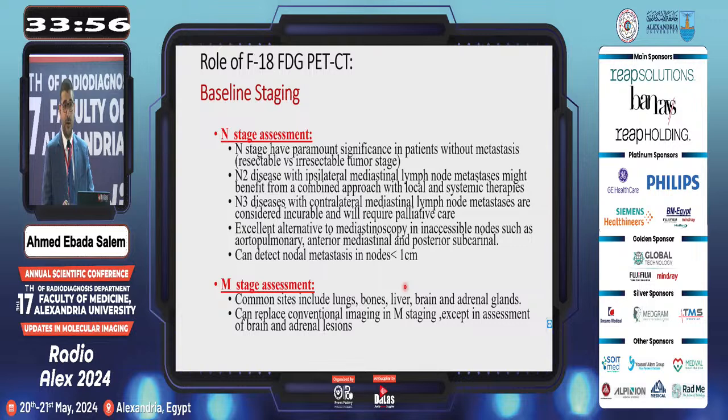So if it's a new adrenal nodule that developed during the course of treatment, we can suggest that it's metastatic disease, but on a baseline, if we're faced with a hypermetabolic nodule in the adrenal gland, we would recommend obtaining a CT or MRI adrenal protocol.